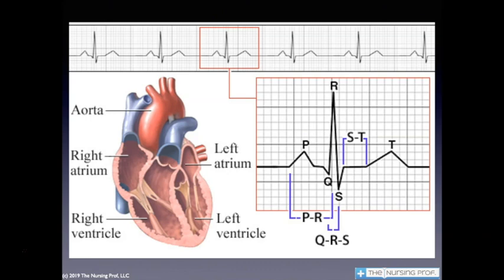So when you're looking at this QRS complex here, go back to before the P wave, and that is where we want our baseline to come back to. So the baseline is literally the line that we started with before we had electrical activity. So on both of these EKGs, the one you see across the top, you see the baseline.